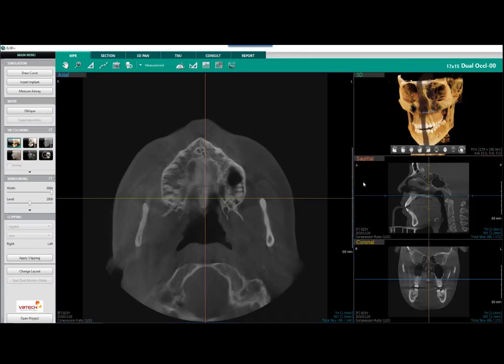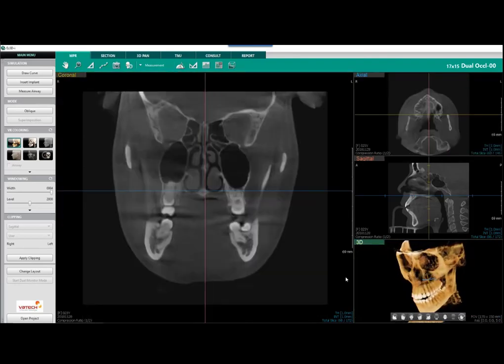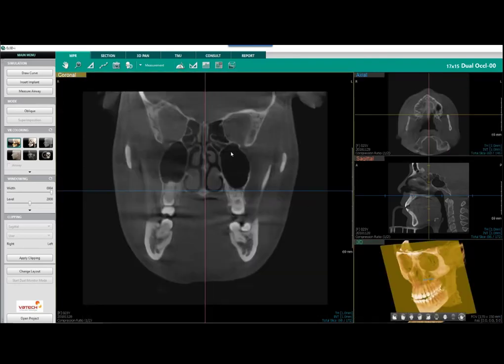Let's go over here, and I'm going to enlarge my coronal window by right clicking and switching to the main view. So you can see my coronal view here. It's our AP view, our anterior, posterior. You can see here we have our right side and our left side. This is highlighted in gold or yellow, and you can see my gold or yellow slice here.